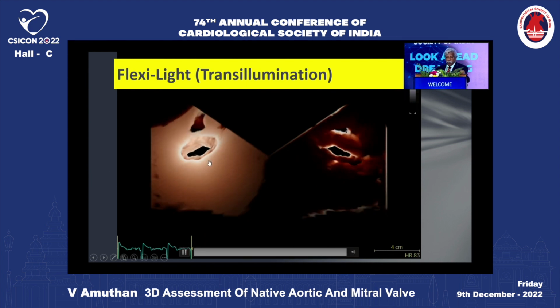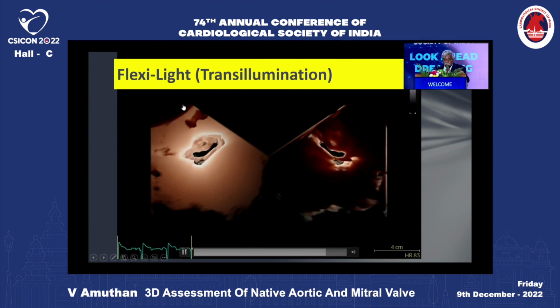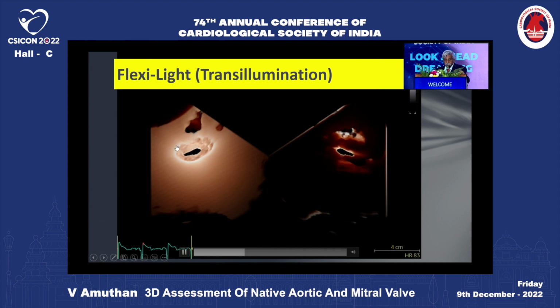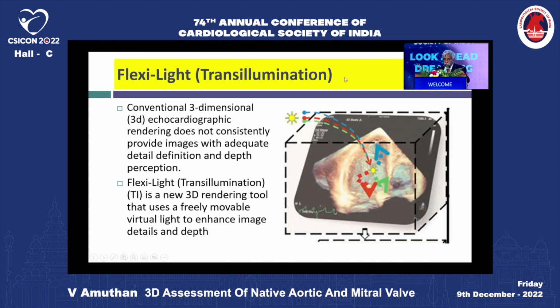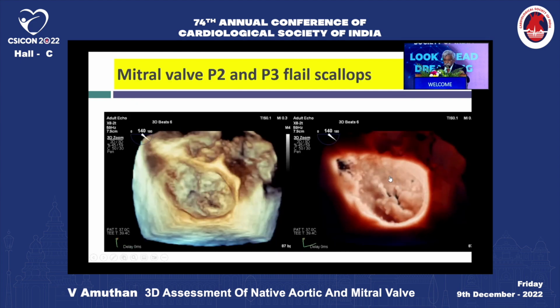That's what I was telling in the morning. This is called transillumination by one vendor and flexilight by another vendor. It is simply a software to keep a light source. You can keep it anywhere. You can move it in the x-axis, you can move it in the y-axis, or you can move it in the depth. That is the transillumination. This is called the flexilight technique. This light source can be placed anywhere, can be moved anywhere, so that you see that with ease.